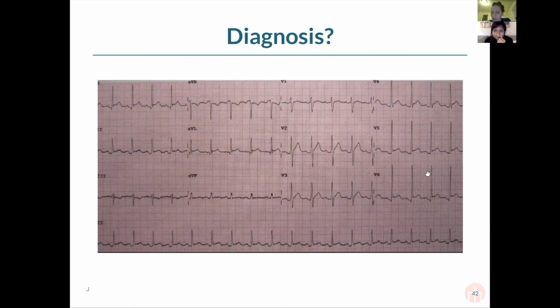I see a couple of answers coming in. Some of them are kind of right. Like I see people seeing ST elevation. I see someone saying a STEMI. Ooh, this is a really good differential to think about. They said anterior leads. Interesting. Yeah, I do see some elevation. Remember, when you're looking at an EKG, look up, look down, look all around, look at every lead. And there's something very classic that we notice about this EKG and how the elevation is very diffuse. It's actually not just in a specific distribution.